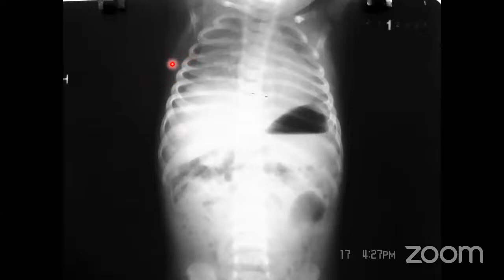But if you follow, just look, I told you that you must see the soft tissues. Here, in the soft tissues, we cannot see anything. But if you follow the anterior axillary line, this is the anterior axillary fold. It is very heavy, and that's why it has misled you to the diagnosis of right-sided pneumothorax. So this is a heavy anterior axillary fold, which naturally is soft tissue. So be cautious enough in interpreting. Try to see the child first.